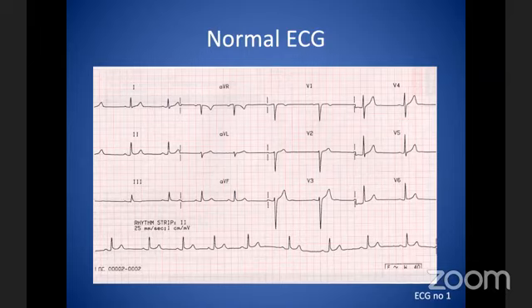Any pacemaker. Yeah, okay. So presence or absence, but if you see it, what else? Someone said shape of QRS complex, broad or narrow. Yeah, QRS complex. So it's broad or narrow.